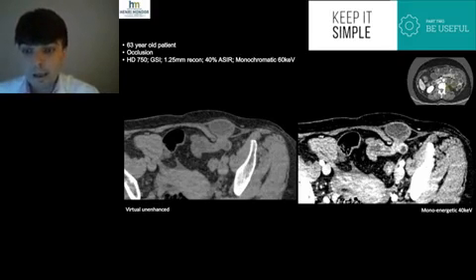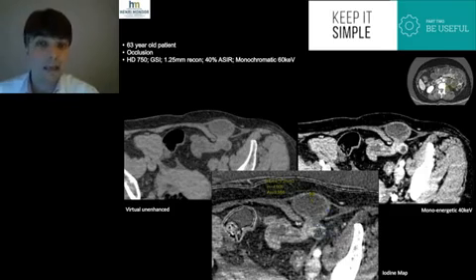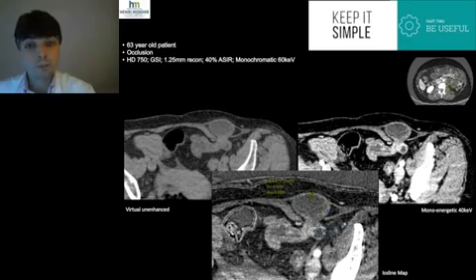Okay, so this is the last set of images that you can derive from that, which is the iodine map, which provides similar information to the monoenergetic low KV levels, because you can actually measure the concentration of iodine within the bowel wall, compare it to normal bowel wall, and make sure that you have confidence that that patient, although he has a hernia, which of course explains the bowel occlusion, there is no bowel wall suffering, and maybe you can reduce the hernia and not go directly to the surgical ward.